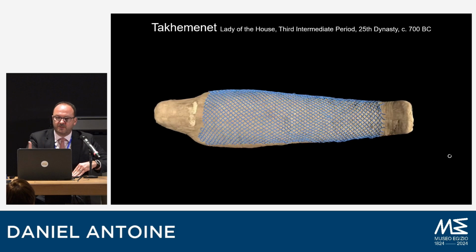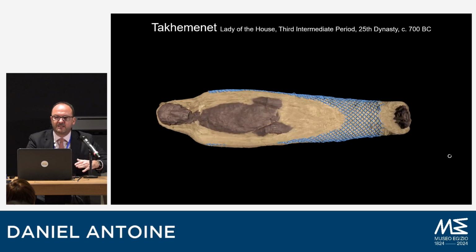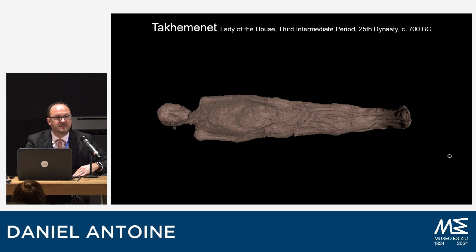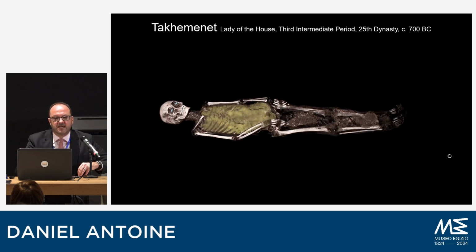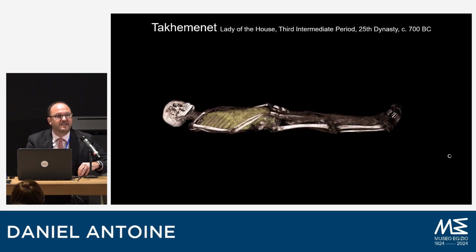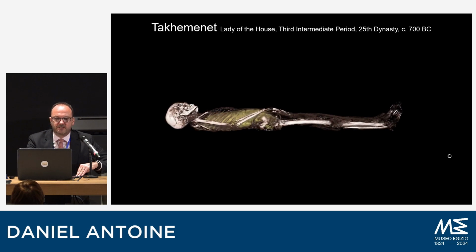And then we go on exploring mummification, cutting through the body. So in this particular period, 25th Dynasty, you can see the features are less clear because the body has been covered by a greater amount of resin. And in this particular period, the organs tend to be removed. The chest has been packed by this granular material. The organs have been dried separately and then placed on top of the legs. And as an added variation, which tends to appear increasingly in this period, the brain has been left in place. And as we cut through the body, you'll see the brain highlighted in pink.